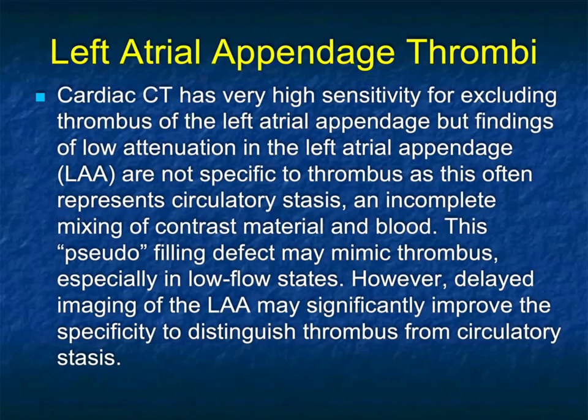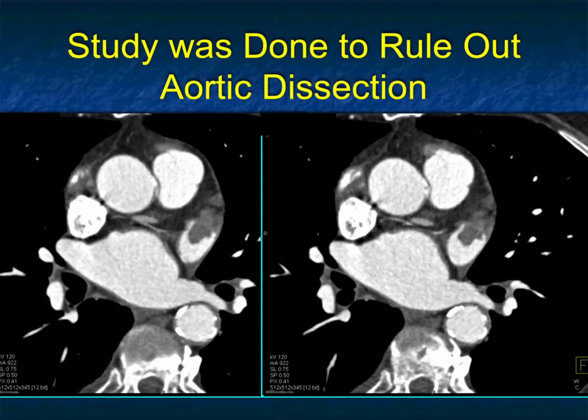We do look at the left atrial appendage a lot now, particularly in patients who are going to get cardiac surgery, like TAVRs. If you have thrombus in the left atrial appendage, which is more common in patients with poor cardiac output or big atrial appendages, they'll often put devices in, such as a Watchman device would be one example.